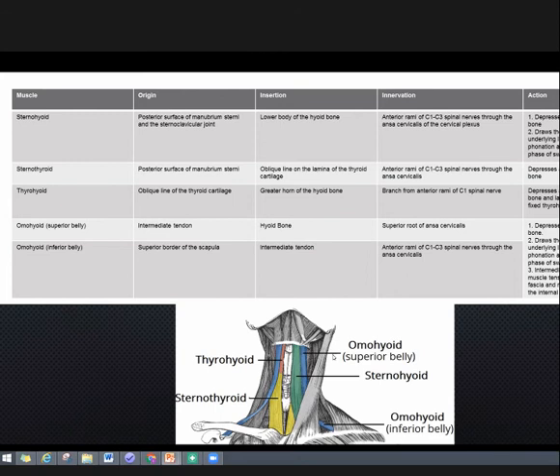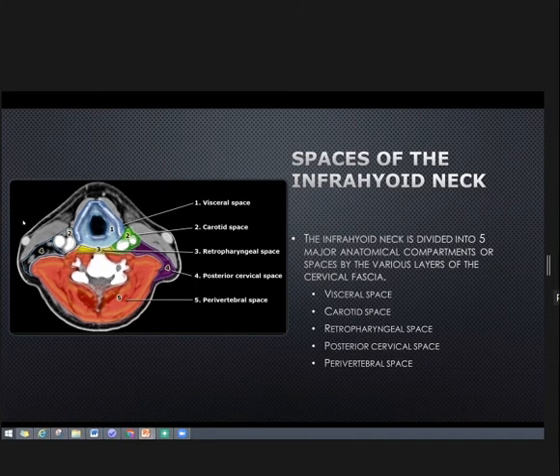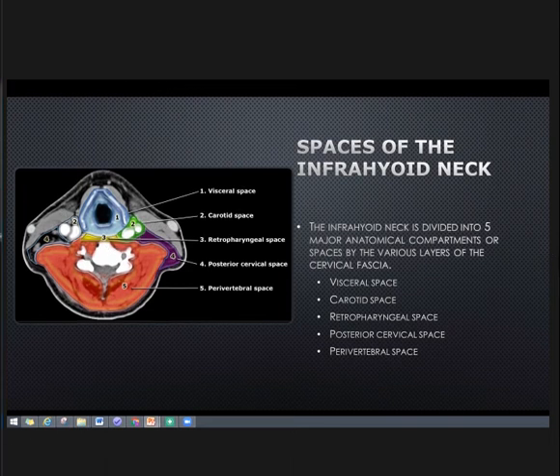The blue one on the anatomical left side is the omohyoid, superior belly, and the cervical fascia. These spaces are easily recognized in a CT axial plane, as depicted here in the image: thyroid, hypopharynx, and cervical esophagus. The carotid space is a paired space just lateral to the visceral compartment, which contains the internal carotid, the jugular vein, and several neural structures.